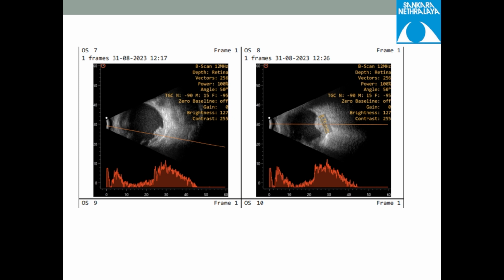So what you have is tissue, choroid, and you're no longer seeing the choroid. It appears that it's completely hollow there. That's because of loss of energy. By the time it reaches this, there's acoustic hollowing. It's just that the choroid is no longer choroid. It is replaced by a tumor.